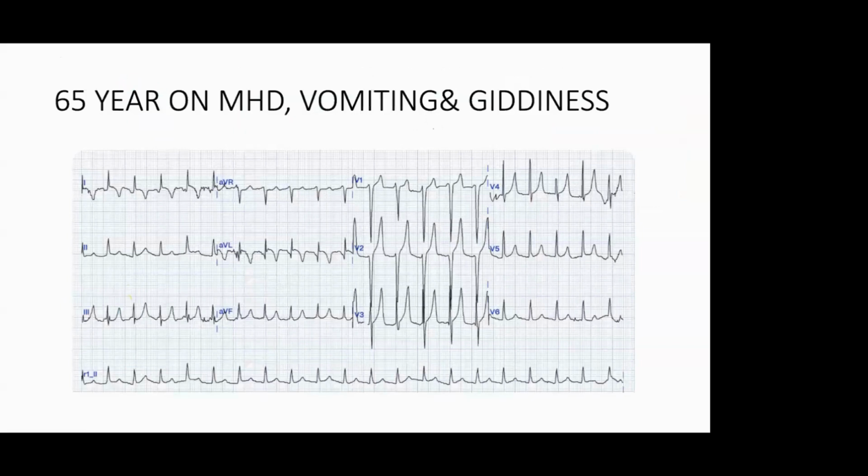Can anyone tell the diagnosis of this patient? A 65-year-old on maintenance hemodialysis, presenting before dialysis with vomiting and giddiness. What is the diagnosis? Hyperkalemia. Correct, very good. This is hyperkalemia.